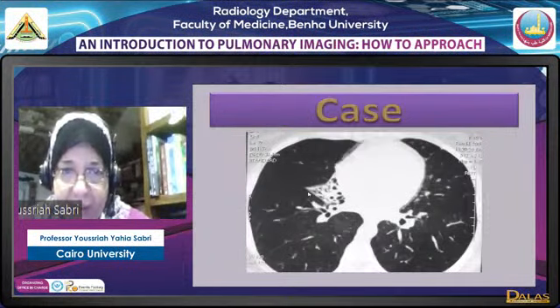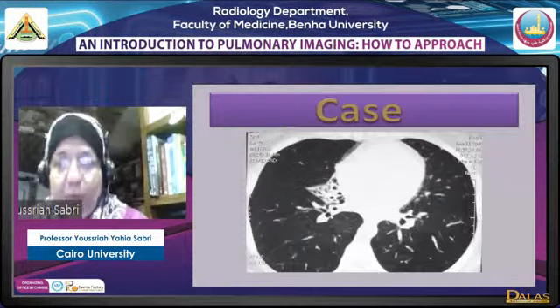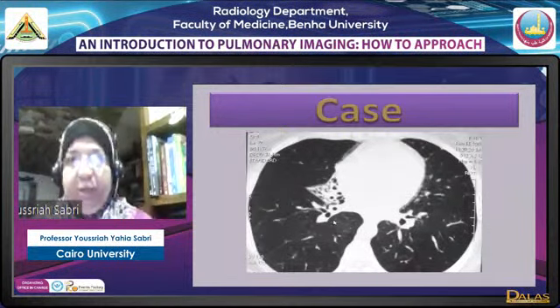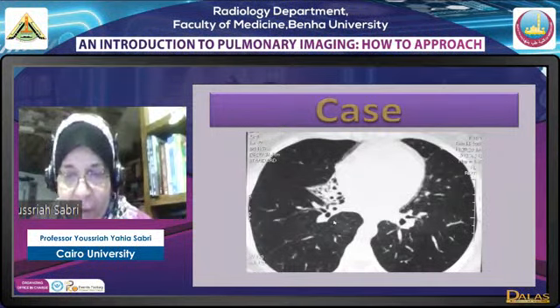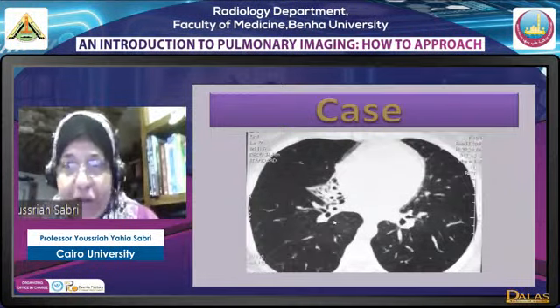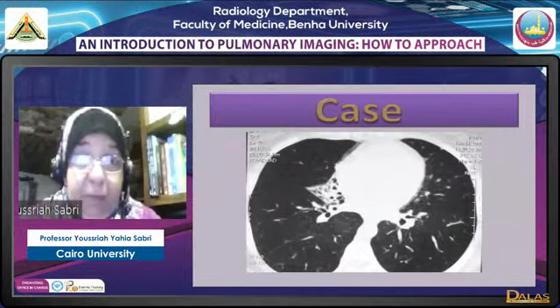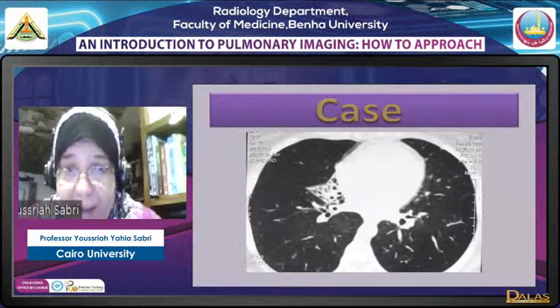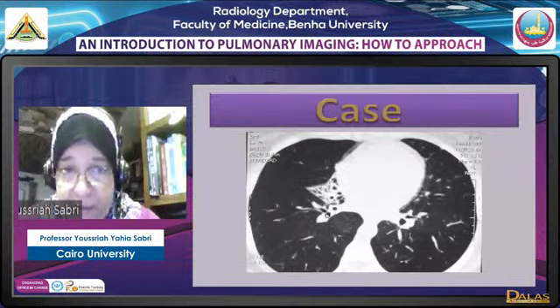Same appearance in this triangular lesion. Now, when a patchy opacity, whether fibrosis, consolidation or collapse, reaches a fissure, it becomes well demarcated by a linear or a curvilinear appearance. So we have demarcation here by lines, meaning that we are dealing here with fissures.